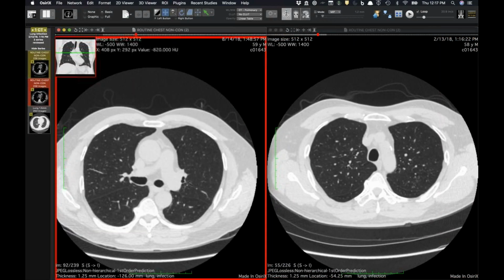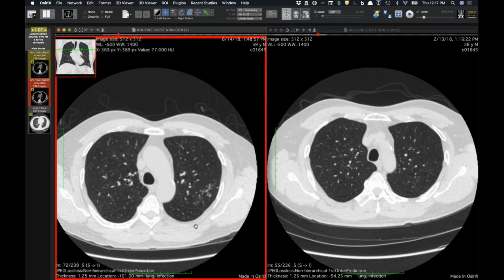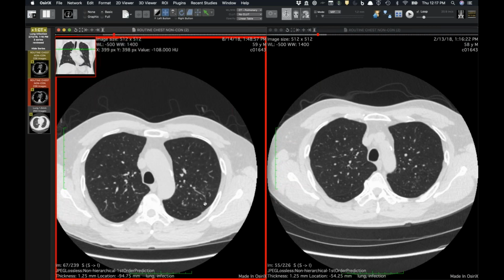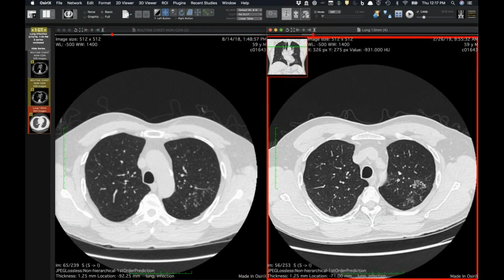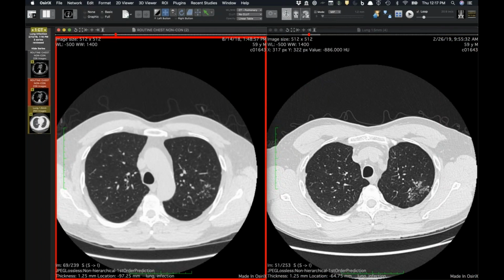And just because he was immunosuppressed, I was worried it was more than just run-of-the-mill infection. I talked to the clinical team and said, has he been worked up for fungal pneumonia? Does he have symptoms? Could he have TB? He didn't get follow-up at that time. He was supposed to see a pulmonologist, then got this CT 6 months after that. This was actually done elsewhere, but sent back to our tumor board. And so I saw this one as well.